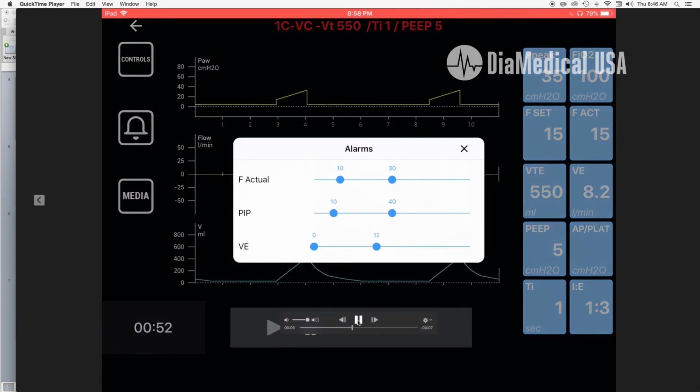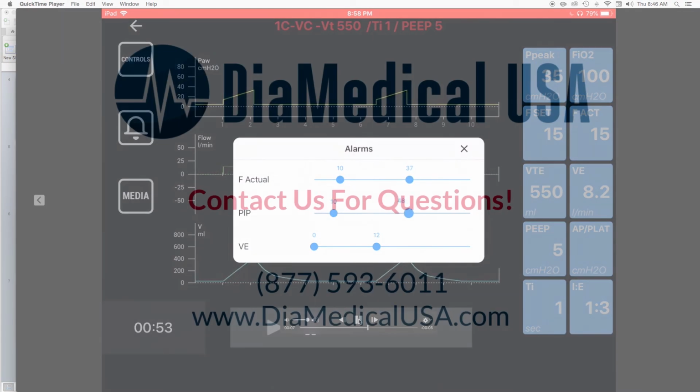Another important feature in the student application are custom alarms. The alarms have preset ranges. The alarm will sound once the scenario escapes from these ranges. This alarm also applies to the patient physiology monitor. The student can go in, reset the alarm, and monitor the patient that way, just as they would with a real-life scenario or real-life monitor.